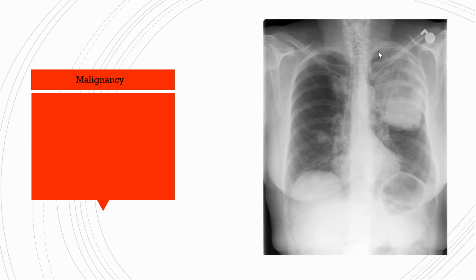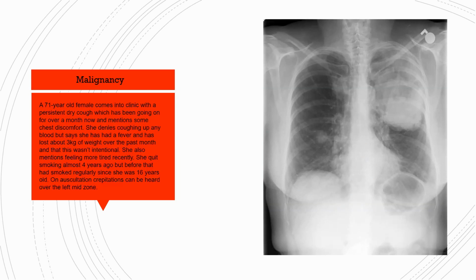Sorry, let me go through the answers again. Those of you who said tumor, that's right. The one who said pneumonia, that's not wrong. I think because there are different lesions in random places, that really looks like a metastasis, doesn't it? Because you wouldn't have just pneumonia on a randomly small metastases in the corner. You know, it's a small spot of something. It sounds a lot like a metastasis. Okay, you'd be quite worried. But well done for you guys for tumor and pneumonia. That's different. Definitely some differentials.